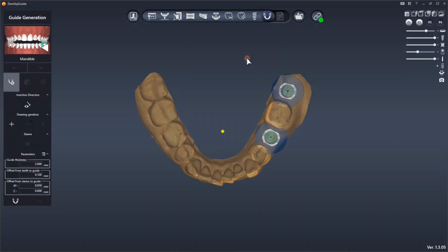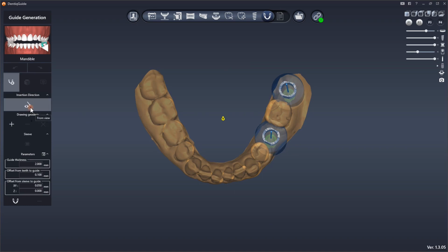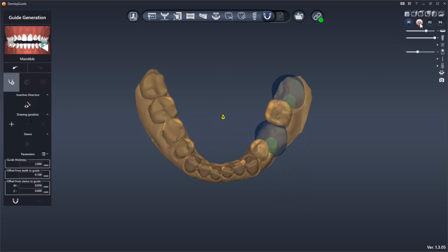Verify that the undercut is properly formed in the model data. Change the viewpoint of the 3D model and click to immediately reflect the modifications made by the arrow.